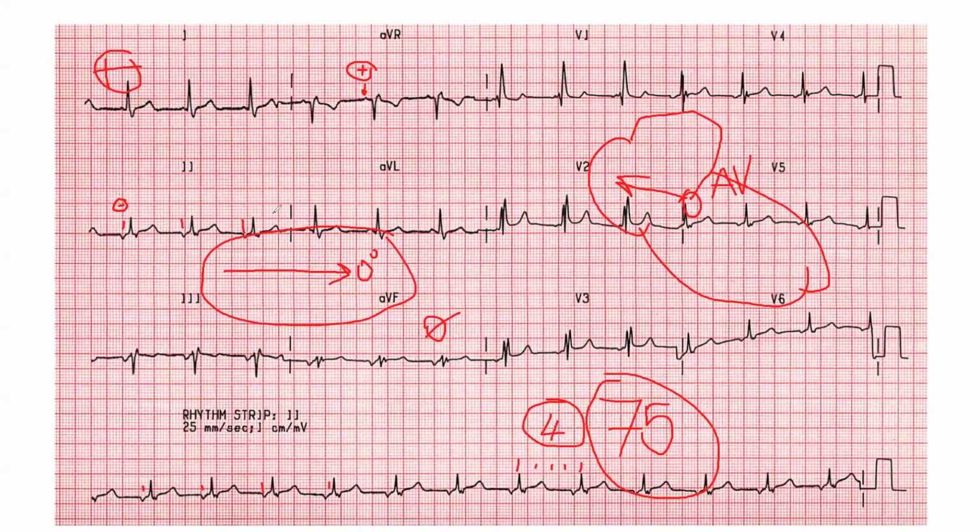QRS. QRS is wide. Yes. It's smaller in lead one.